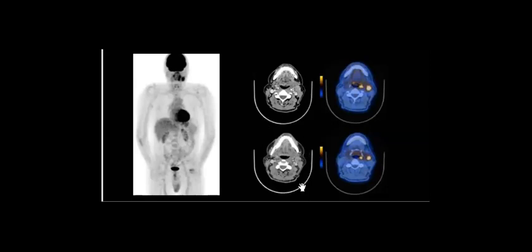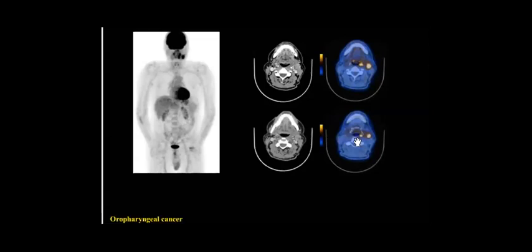And this is the teaching point of this case, Asma: you didn't find anything in the CT, and this happened. Sometimes you cannot find anything really in the CT, no density, nothing. The metabolism in this area is just high, and this is what is called discordance between the finding in the PET CT and the finding in the CT. Then in this case, it will be oropharyngeal cancer as primary. And this is the importance of using PET CT to see the primary, okay?